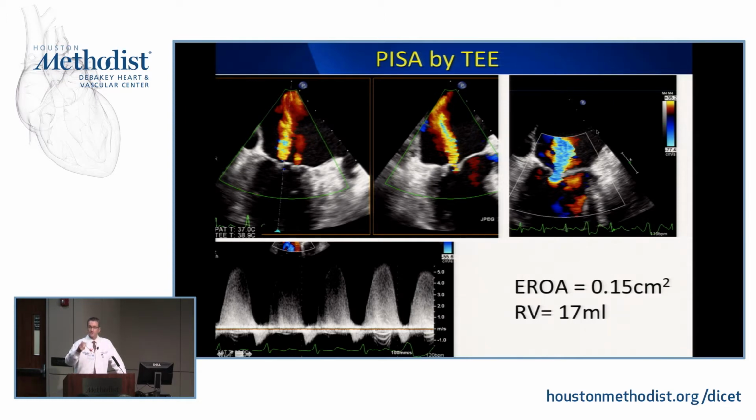But when in doubt, when you have a rainbow and it's hard to determine where to put the top end, just look: where does your velocity change color? That last color to the color above, that interface is the same one you've got to match on the PISA. That's how the math makes sense. Is that what you meant?